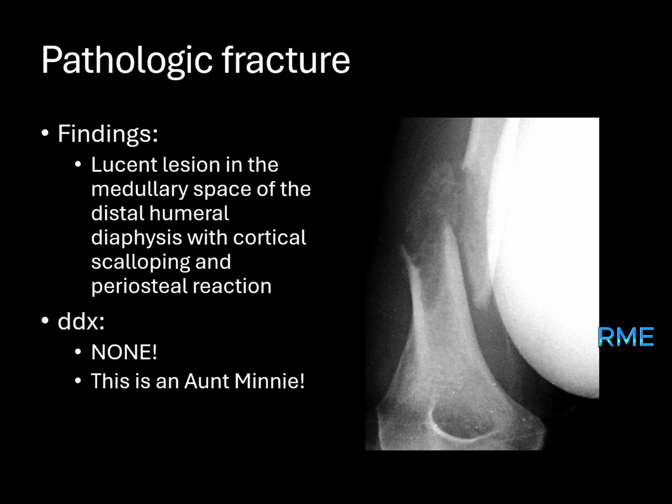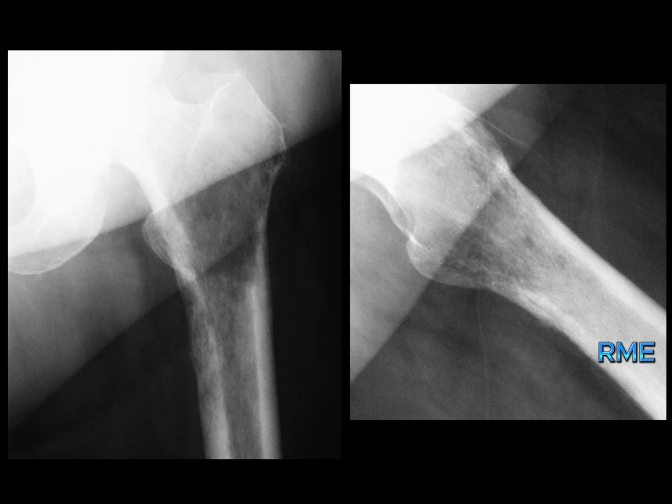To further evaluate, an MRI can help assess the lesion's nature and extent. Management typically involves treating the underlying cause of the pathologic fracture, which may include surgical stabilization, and addressing any associated neoplastic or infectious process.